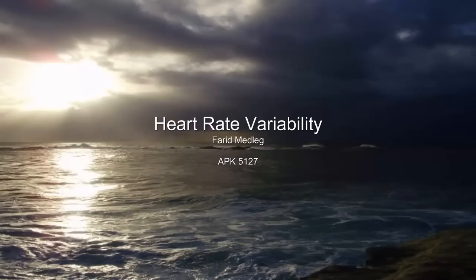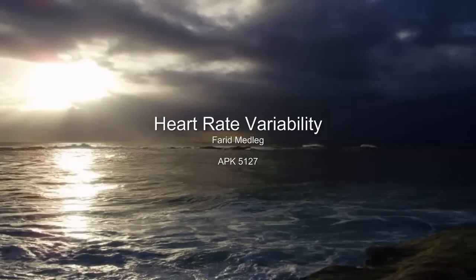The great thing about this video is that you don't get to see my face. Why do you ask? Well, it's because I look something like this. Now, the real reason why you're not going to see my face is simply because all the analysis that we're doing today is based on software. And so I'm going to take you through that software and explain to you how it works and how that theory links to the physiological processes that I'll be talking about.